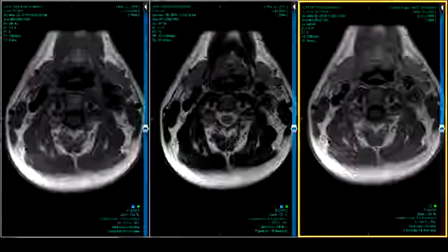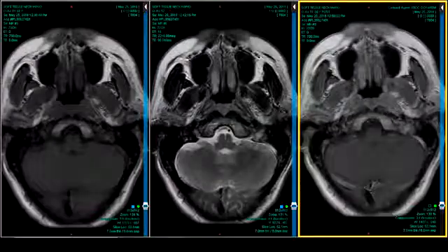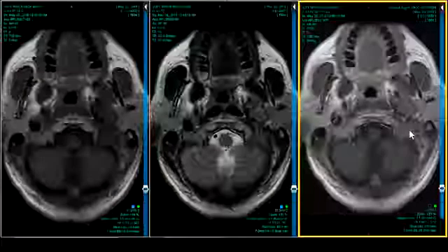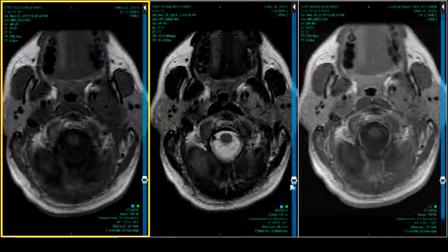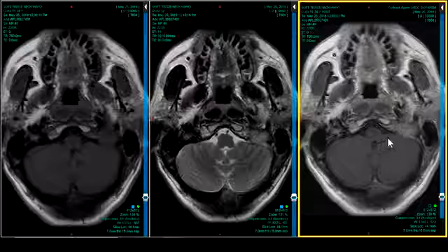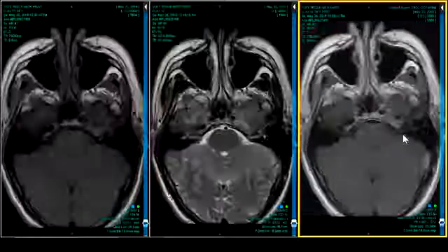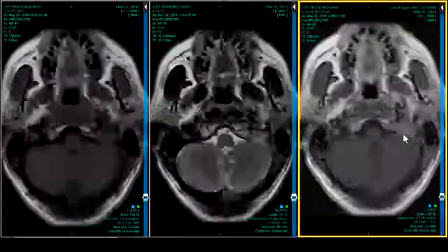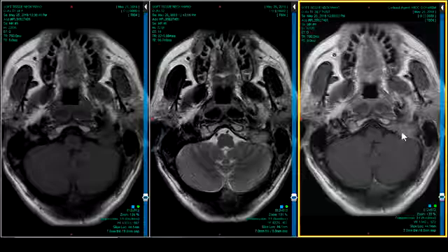All right, so let's get the C plus up. And there's your lesion on the left. So let's talk about the carotid anatomy, and I'll let you drive now. Okay. So here we are, getting the Glomus brothers back together again, getting the band back together, because you got them all right here, just like in the high school picture, okay? So Glomus jugulare, jugular foramen, coming from Jacobson's or Arnold's nerve, okay?